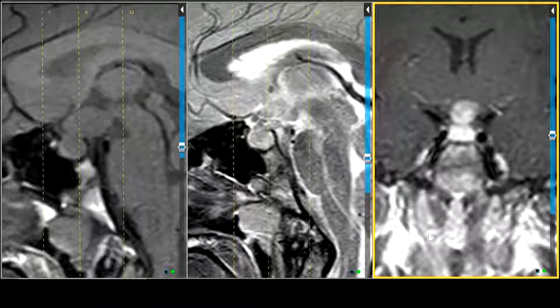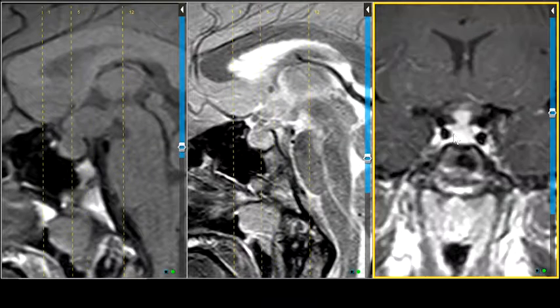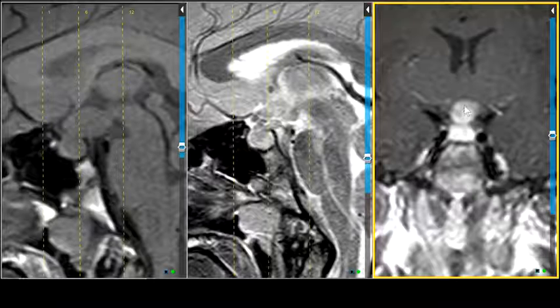Dr. Shupek, this is a 14-year-old with diabetes insipidus, vomiting, and headaches. We've got many sequences here to share with you, but we're going to focus on the sagittal T1 and the sagittal T2 fast spin echo, and then obviously there's contrast enhancement of this abnormality in the suprasellar and intrasellar territories, makes that snowman type phenomenon. And bear in mind, this is a pediatric case. It is a male.